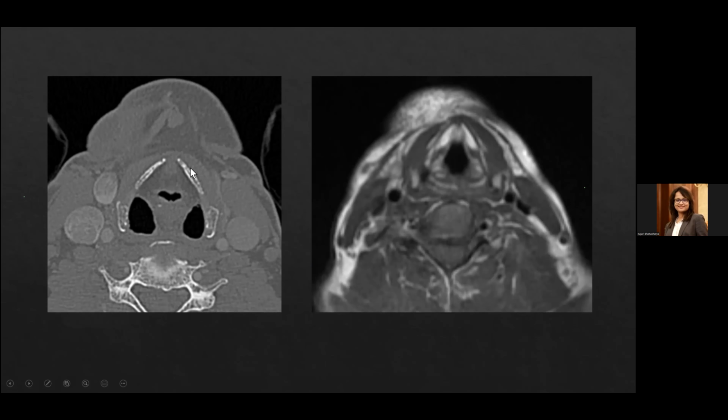The similar thing when we are looking at MRI. So this is the thyroid cartilage. These are the non-ossified parts of the thyroid cartilage, which have similar intensity as the muscle. And these are the ossified parts of the thyroid cartilage. The central part, the medulla, that contains fat, is hyperintense. And this part is also hyperintense. And the boundary of it is quite black, which is the cortex.